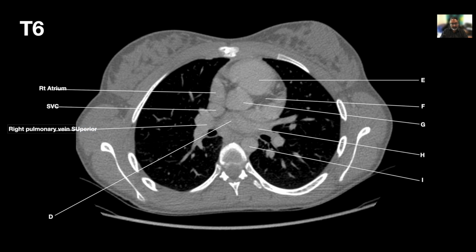Do you want me to check? Yes, I think I would base it off the SVC. It would be this. Yeah, absolutely.